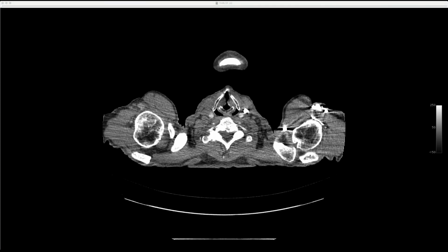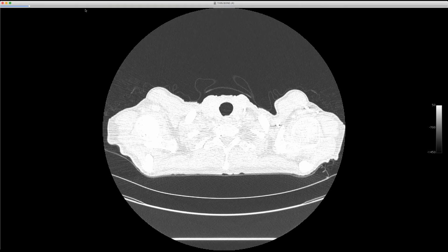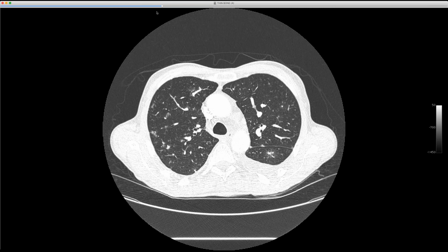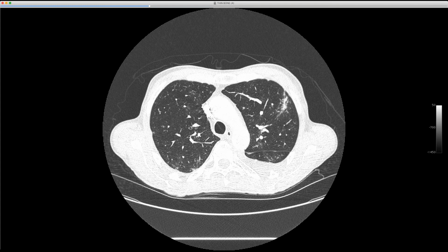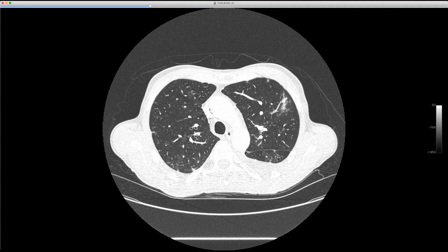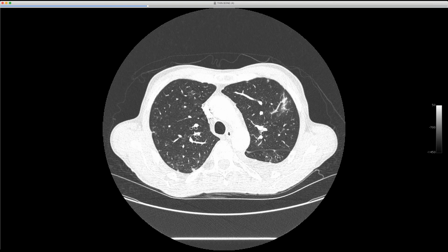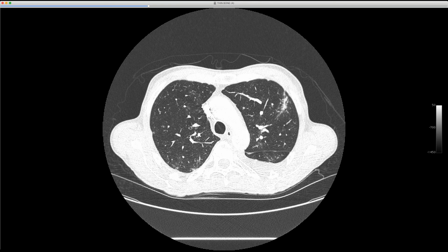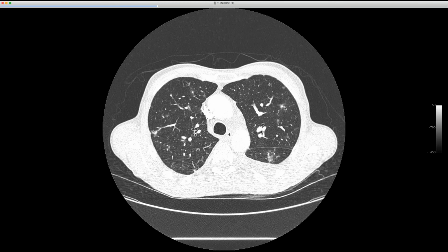Okay, and this is kind of a cool case from an imaging standpoint. Let me show the image here. This is a patient with metastatic lung adenocarcinoma and has bad disease. You can see there's stuff all over. But what struck me about this case, and this is my new sign, is the hairy caterpillar sign. I've seen this twice this week. It's sort of venocentric or angiocentric, I don't even know what to call it. It's not really a nodule, but these opacities in the lungs.